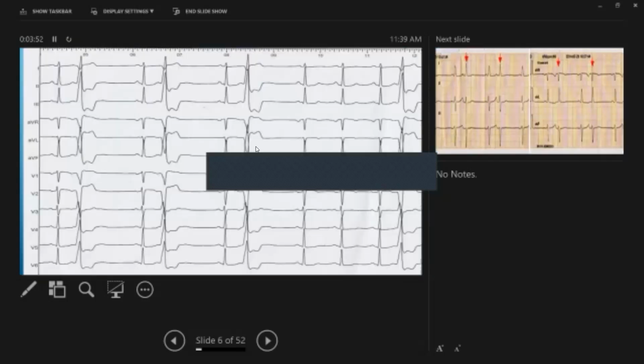This slide shows a 12 lead ECG with a narrow complex beat, which is coupled with broad QRS complexes. Now, you can see a short pause. If there is a pause, we have to find out why. This pause could be a compensatory pause. It could be a sinus block, sinus pause, or it could be due to sinus arrhythmia. So, what is the diagnosis of this pause then?